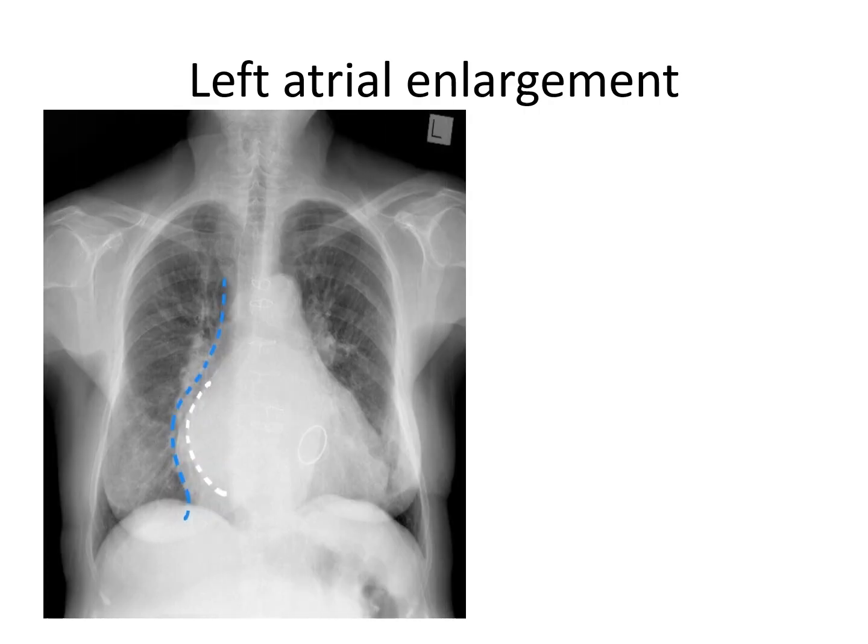Now let's know briefly about left atrial enlargement. What happens in left atrial enlargement and how do we identify it in X-ray? There are direct signs and indirect signs of left atrial enlargement. The first one is the double density sign, that is the enlarged left atrium is seen adjacent to the right atrial border, and this causes the double density sign.